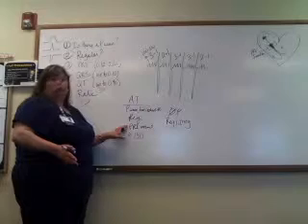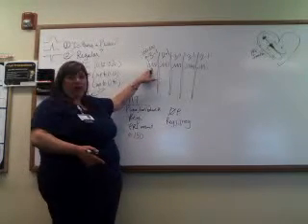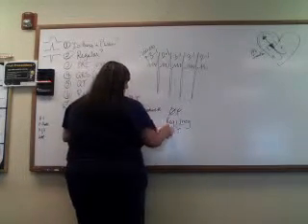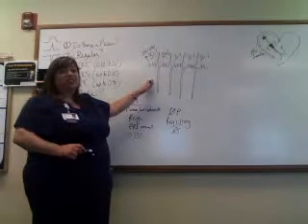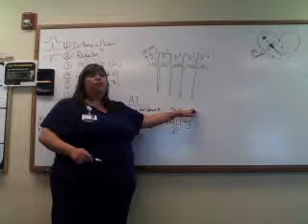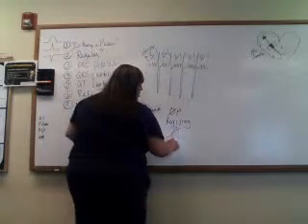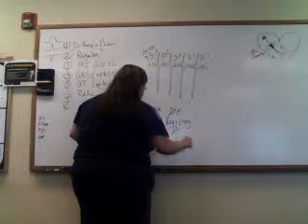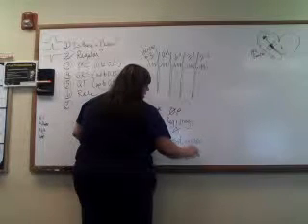PRI, you can't measure a PRI because we don't have one consistent P wave and QRS relationship. So there is no PRI, okay? And then you would measure the rate. Now when you're measuring this rate, you would measure the QRS rate, and that would give you whatever the heart rate was. With this one, you consider controlled to be less than 100, uncontrolled greater than 100, okay?